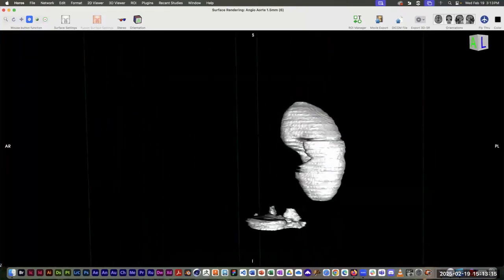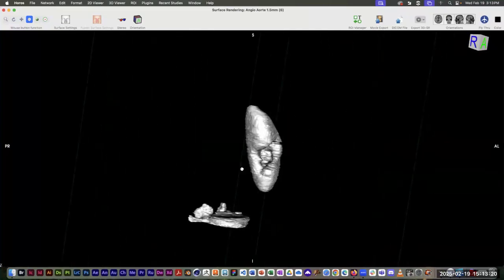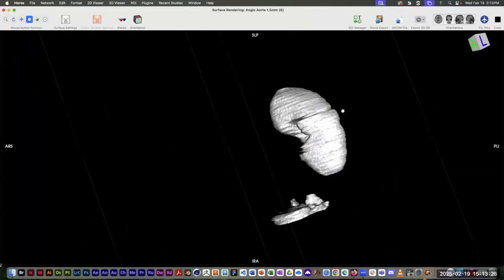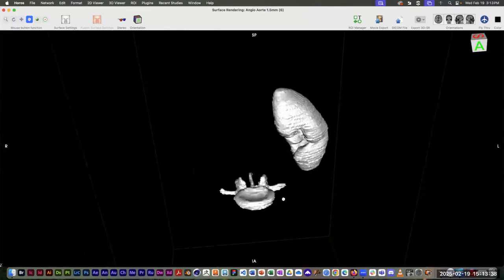So there's our roughly kidney-shaped kidney with nice deep hilum on one side. Now, there's something creating a couple of really deep grooves in my kidney. Probably when it generated missing regions of interest, it just made one that was really funky. I just have to go back and tweak that and figure out why it kept my vertebrae.